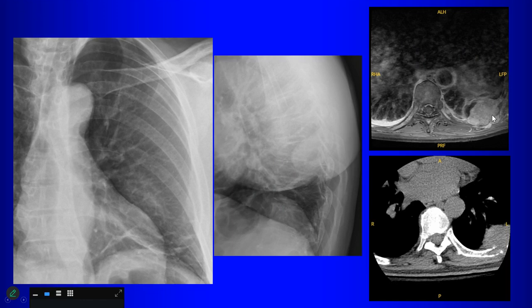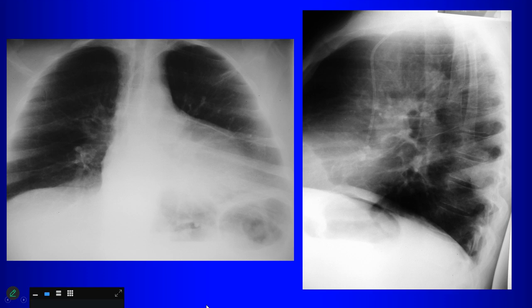Big metastatic lesion in the rib, projecting over the neuroforamina. So you want to look at that on your lateral view. Once you notice that, you go back and take a much closer look. And now you see that vague opacity and you notice that the rib is missing. But of course, you include the ribs on your checklist of things to look at, right? This one.